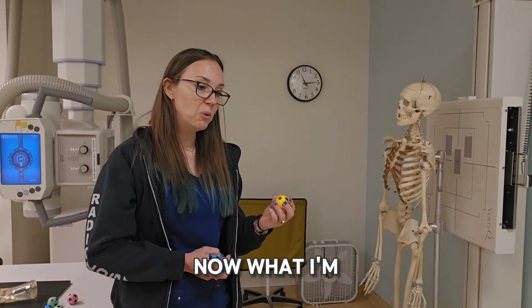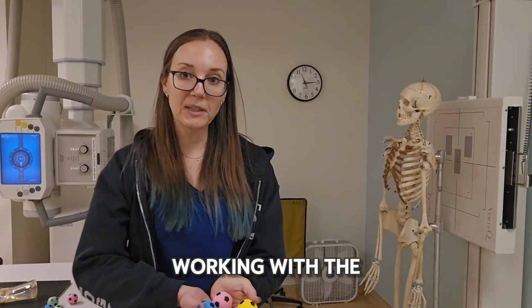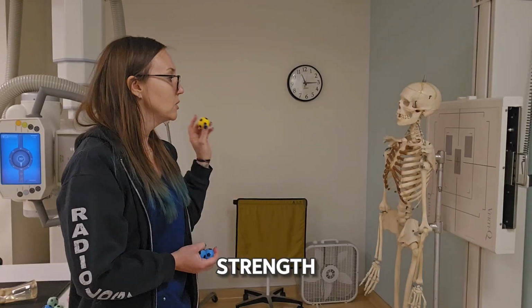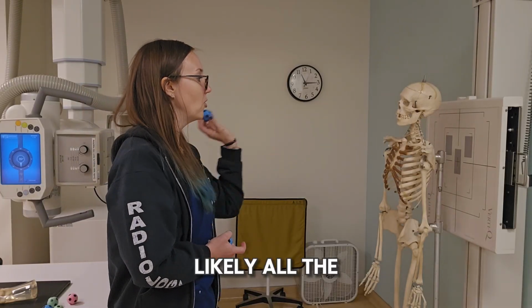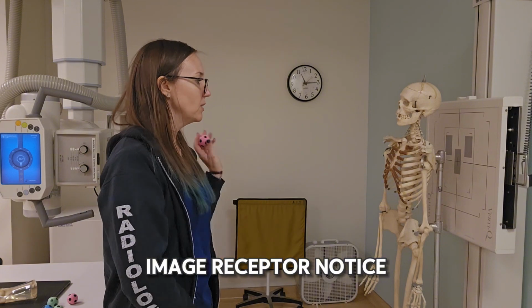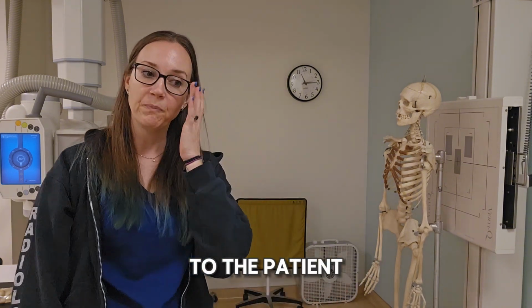So as I go into a higher kVp, now what I'm doing is I'm giving more oomph to the X-ray photons, right? So I'm still working with the same 5 X-ray photons, but now they're going to have more strength. So now they're going to be most likely all the way hitting the patient, hitting the image receptor. Notice that I don't have any balls like just dropping off and not even making it to the patient.